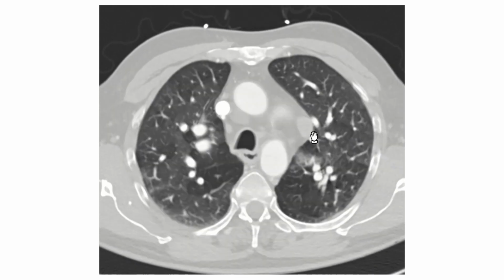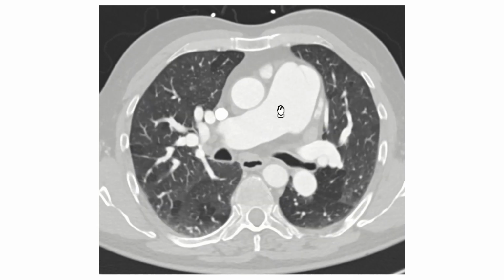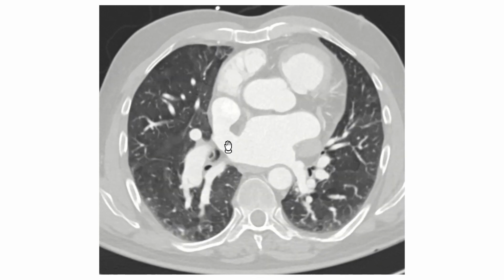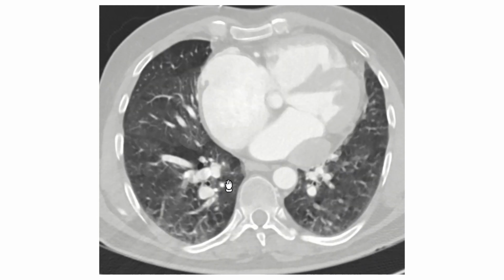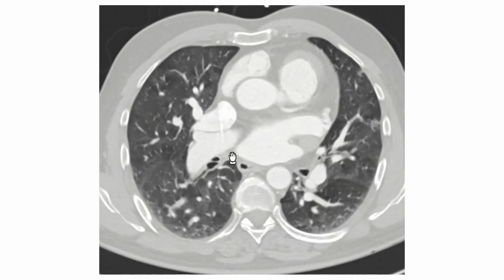We had a left side superior vena cava draining to the coronary sinus. It's a normal anatomical relation of the pulmonary artery to the aorta. So it's a case of a partial anomalous and superior sinus venosus defect. If it was from the inferior vena cava, then we would call it an inferior type of sinus venosus defect, but this one is a superior type.